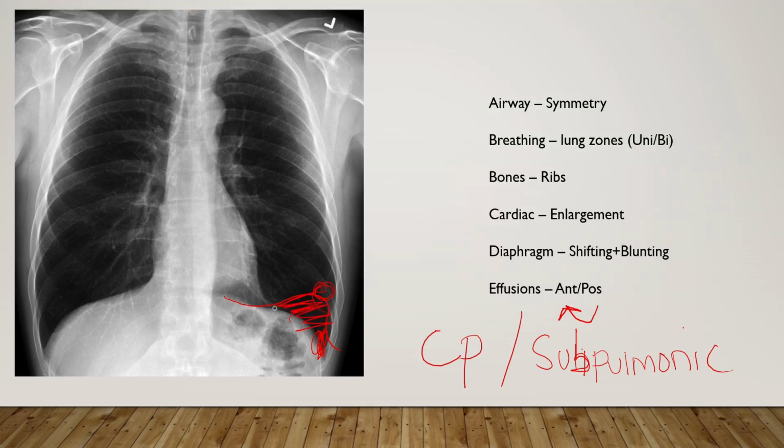Alright. So here you'll see a shifting of the peak. So imagine this is without shifting, and this red here indicates an apparent shifting of the hemidiaphragm. But there's no problem in the diaphragm. It's just this effusion that's given the illusion that the diaphragm has actually shifted when it hasn't. It's just the effusion that's caused this illusion.